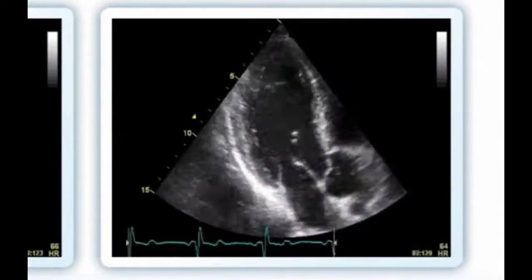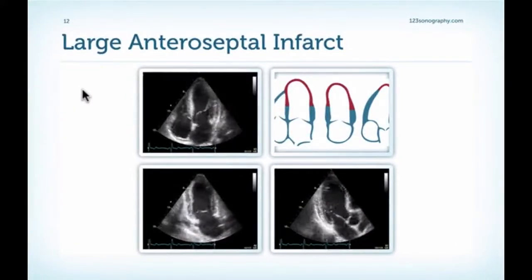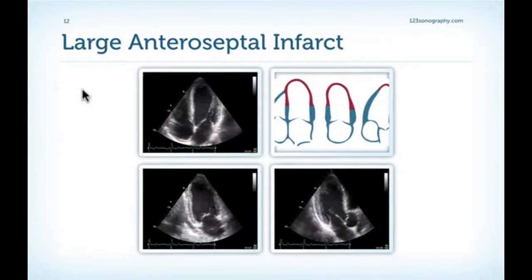So this patient has a very large infarct, and if the patient does not have a reopened vessel, I'm certain he will have a large scar and a very high risk for remodeling.